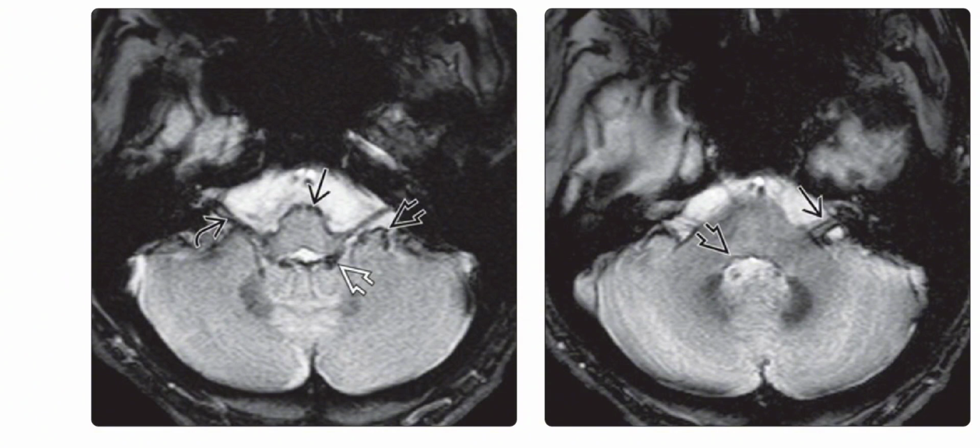Left is the axial T2 star GRE scan in a 51-year-old male with bilateral sensorineural hearing loss and remote history of resection of a left frontal oligodendroglioma. It shows the hypointensity coating the medulla, cerebellar flocculi, cranial nerves 9 to 11, and staining the fourth ventricle choroid plexus. Right is the more cephalad scan in the same patient, and it shows the superficial siderosis of the 7th and 8th cranial nerves, as well as the ependyma of the fourth ventricle.